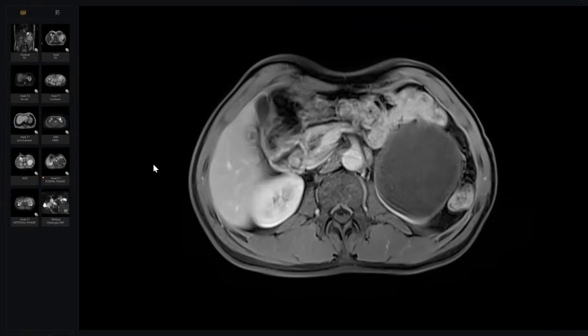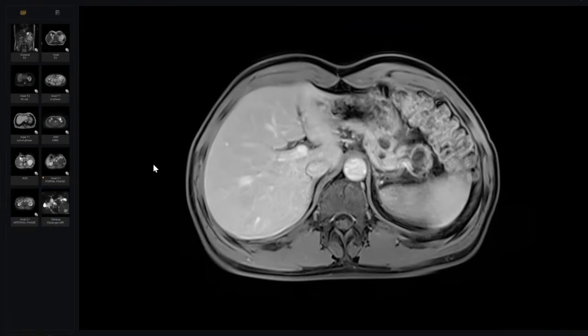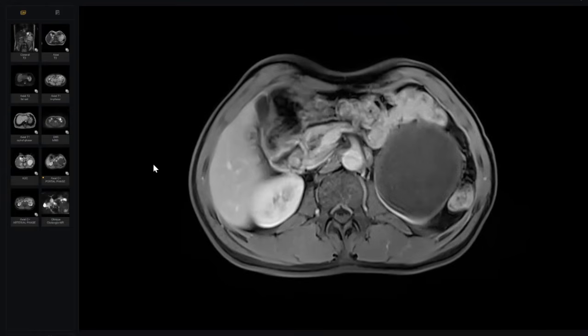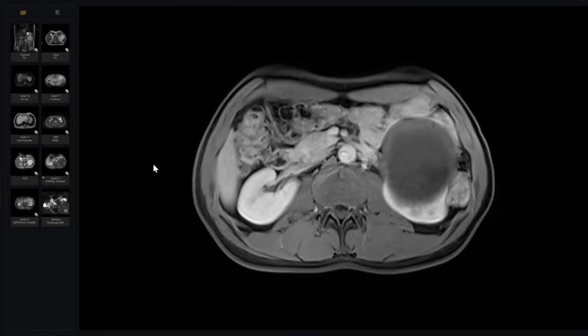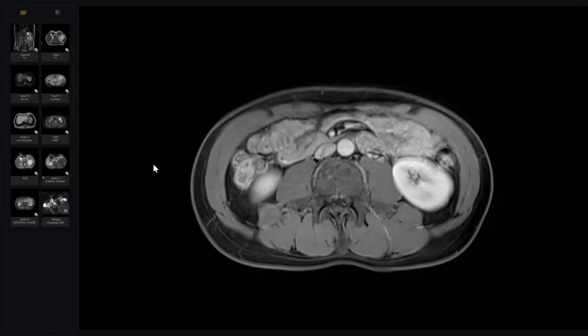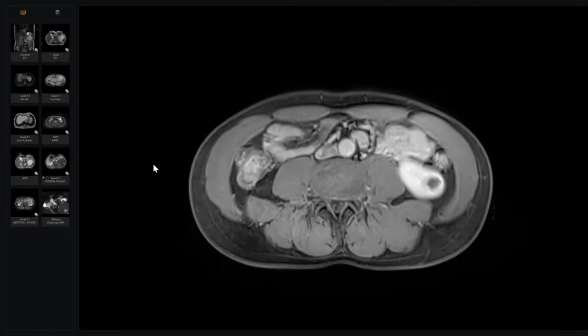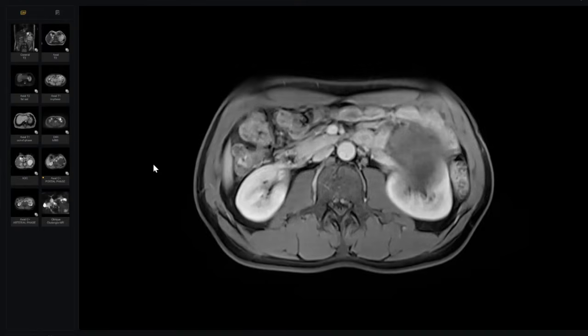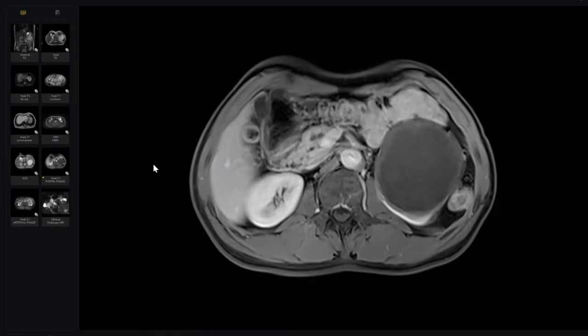So this lesion is making a claw sign with the kidney. So most likely this is a renal cyst with calcification with no significant enhancement. This could be a Bosniak type two cyst with faint peripheral calcification. The patient has presented with abdominal pain. I would just quickly check the other sites to look for any other cause.